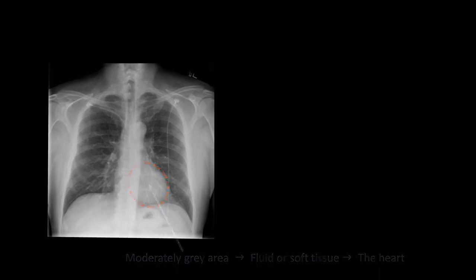Since the layout of the human body is amazingly consistent from person to person, each major line and shape on this X-ray corresponds with a known and identifiable anatomic part. I'll review these parts in Lesson 2, but before then, there are two quick practical things to point out first.